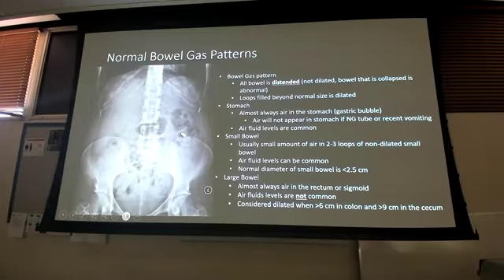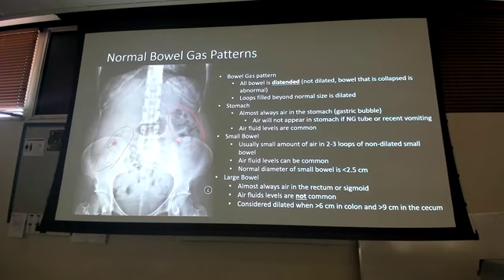All right. Small bowel, sometimes we have some loops. And then again, large bowel, there's some descending colon. Okay. You can see here how I have the ascending colon. And then I have gas and this mottled appearance. You guys see the mottled appearance? All right. That's stool mixed with gas. It kind of looks like a sponge is sitting in there, but there's some air sitting in there. It's got that spongy texture. That's stool as opposed to bowel gas.